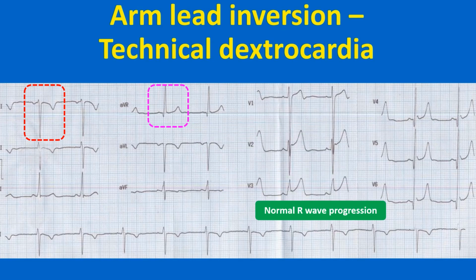In addition, this ECG also shows narrow Q waves and prominent T waves in lateral leads with mild concave upwards ST segment elevation. The S waves in lead V1 are deep and the R waves in V6 are tall, possibly an evidence of left ventricular hypertrophy by voltage criteria.